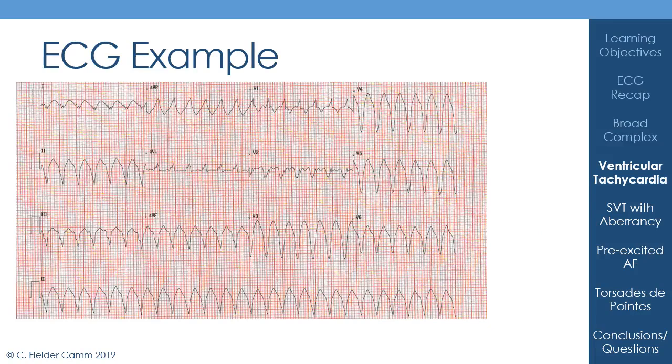Okay, so time for an example ECG. So I'll give you a couple of seconds to pause the presentation, and then you can go through it in your own time, and then I'll go through it to catch up with you. Okay, so hopefully you've had a chance there to go through it.